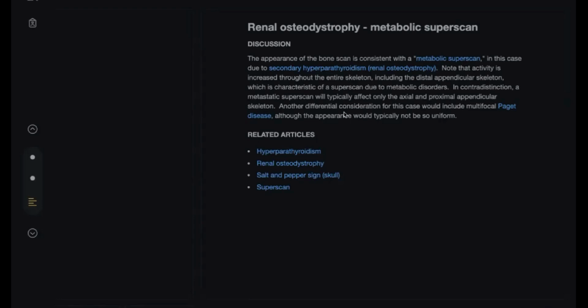If you mean the case before it, it was a sclerotic mets, the case that has a sclerotic rib, prostatic sclerotic mets. No case. We didn't get any case with ureteric stone. It was transitional cell carcinoma.